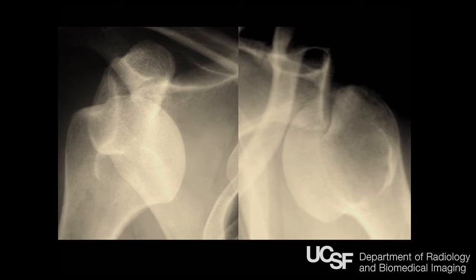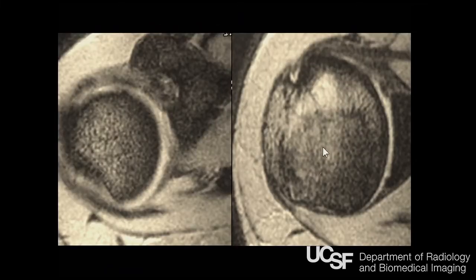And they have what's called a positive apprehension sign. They say, oh no, I can't move my shoulder any more than that, I might dislocate. They know that it's going to happen. If it's a deep trough, it will just catch and then force the shoulder out with just another degree of movement. So the Hill-Sachs deformity, this is a 45-45 view showing it.